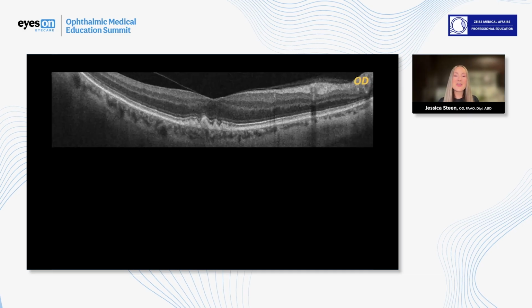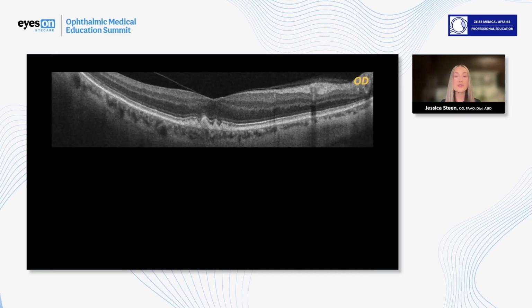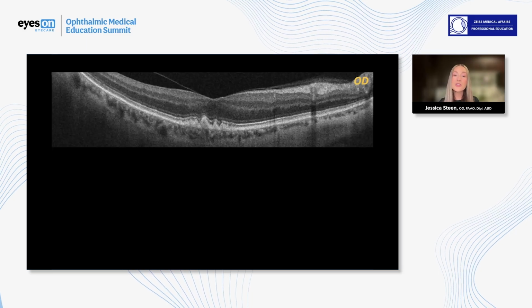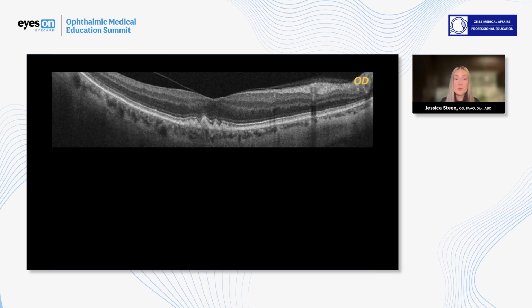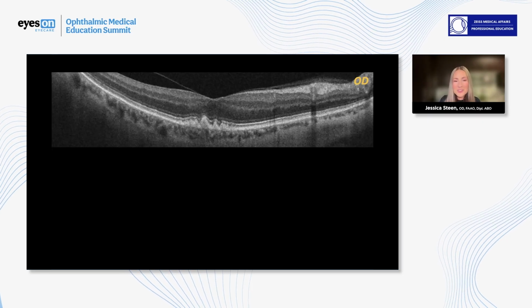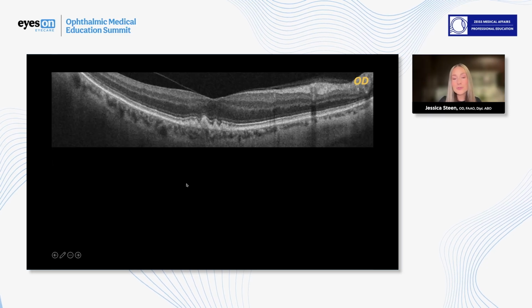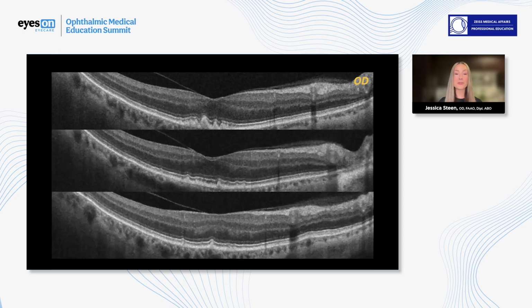Now, looking at the OCT, B scan by B scan, we know this is important to either sit down at the device to scroll through each B scan or to utilize a workflow management system to be able to evaluate the imaging in its totality. What we see starting at the center of the fovea in the right eye, this is the 21-line raster, we see that there is vitreoretinal interface anomaly, and we see drusen within the center of the macula moving inferiorly.